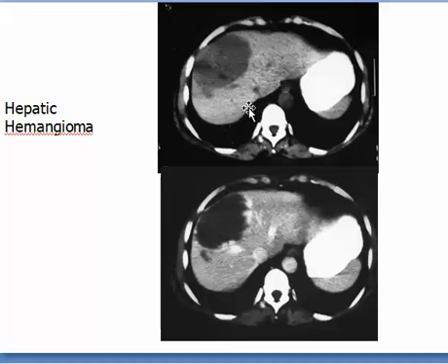In this one we have a giant one, which again appears as abnormal low density of the liver, rather well defined and well demarcated, and after contrast we have the nodular marginal enhancement, which reflects the blood pools at the margins and the compressed capillary bed surrounding the lesion, and it starts to fill.